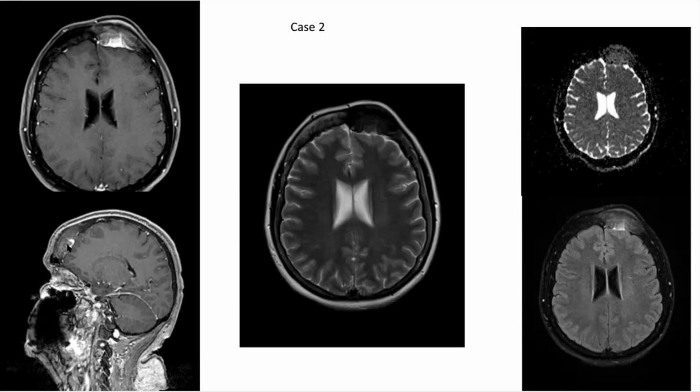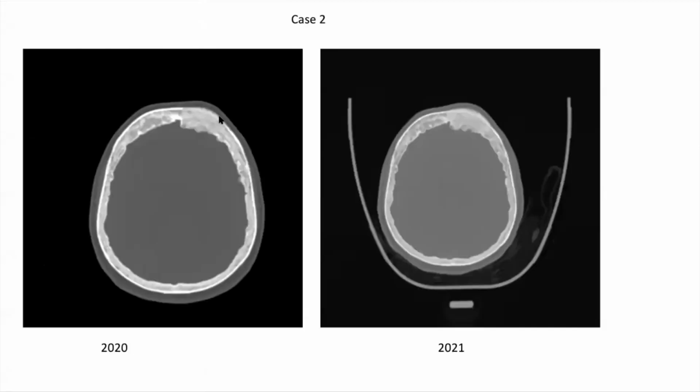So can you offer a diagnosis here? I'm going to show you one other piece of information. This is the CT scan from 2020. This is the CT scan from 2021.